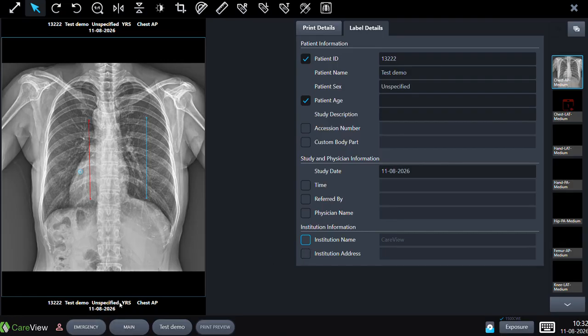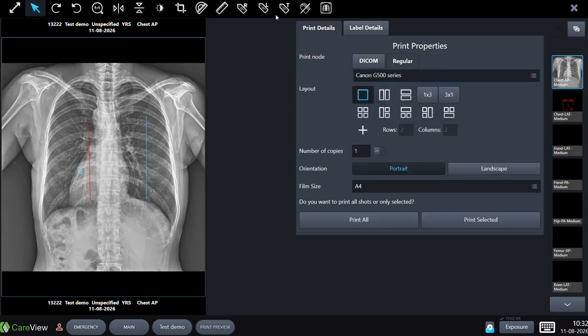Right now, with the settings that I have on my computer, you can see that the image text or the image information is being shown at the bottom and at the top. It can be changed if you only want it at one of the places. It can be done. If you want it to be on the corners, you can do that as well.